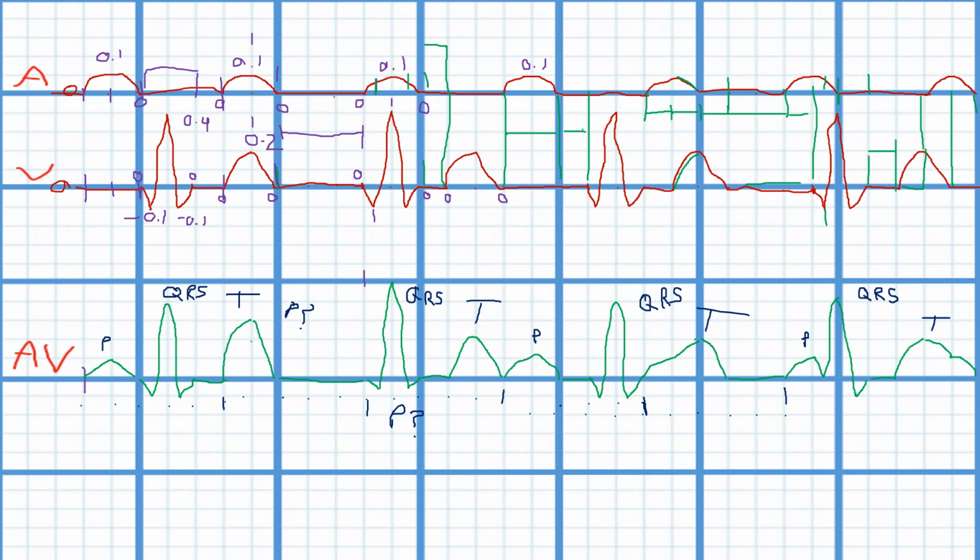All right. So yeah, that T wave kind of looks a little goofy right here. So is that a P wave? All right. 1, 2, 3, 4, 5. Oh my goodness. The next one came exactly where it's going to come at. This T wave over here looks a little goofy. Let's see what you got. 1, 2, 3, 4, 5. Is this where you got your P wave at?